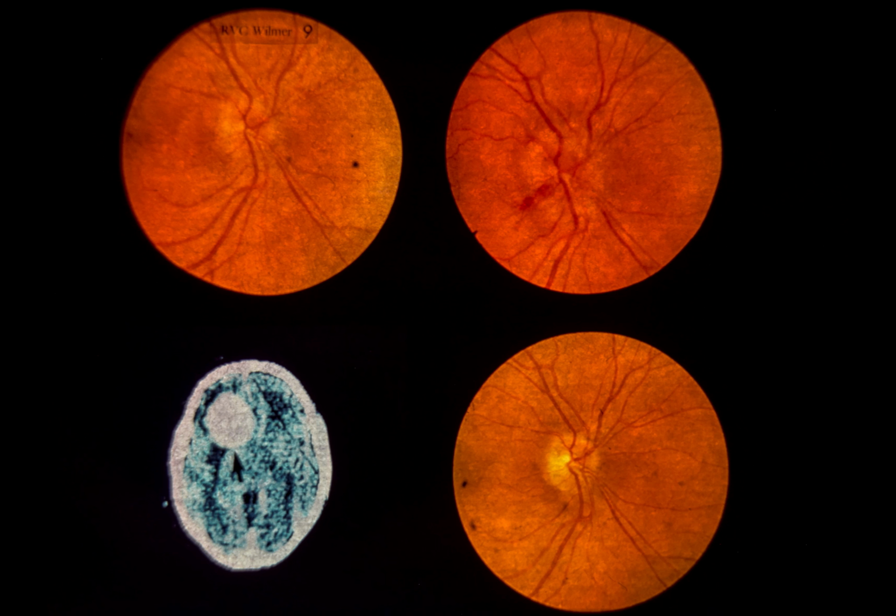Upper left. The right optic disc is mildly hyperemic. The disc margin is indistinct. Over the next 24 hours, the patient became lethargic. Upper right is a photograph taken 24 hours later, showing fully developed optic disc edema with a flame-shaped hemorrhage crossing the disc margin. Lower left. An EMI scan demonstrates a large mass in the left frontal lobe with a marked left-to-right shift of the midline. Lower right. 6 months after removal of a large meningioma, the right optic disc appears normal.